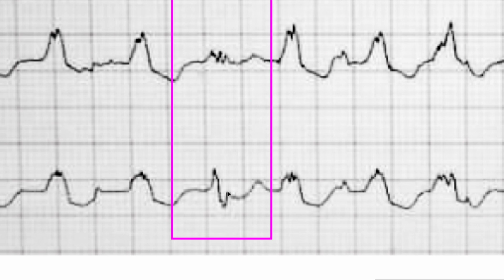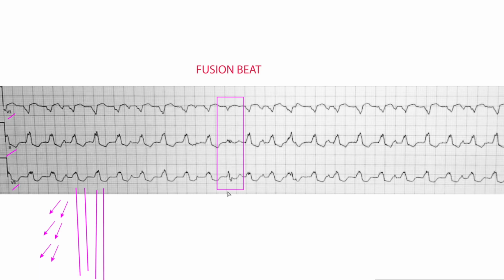I purposely use these ECGs because when you deal with ideal stuff, great, and then you get out into the real world and you get something like this, the first thing you want to do is just give up or hand it back to whoever handed it to you, and go take a break. But that's not the case. A lot of times you'll have to deal with stuff like this. So here it appears that we have a fusion beat, in correlation with atrioventricular dissociation, which is what we appear to be looking at on that first screen. These are both hallmark features of ventricular tachycardia.